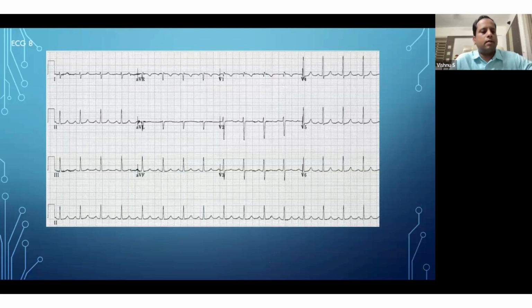So can anyone tell me the ECG diagnosis?